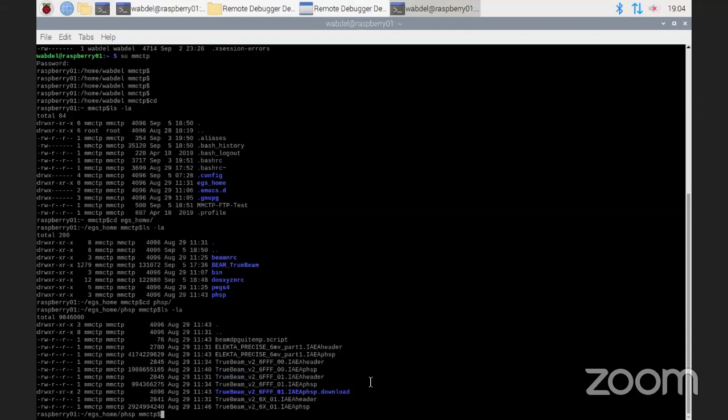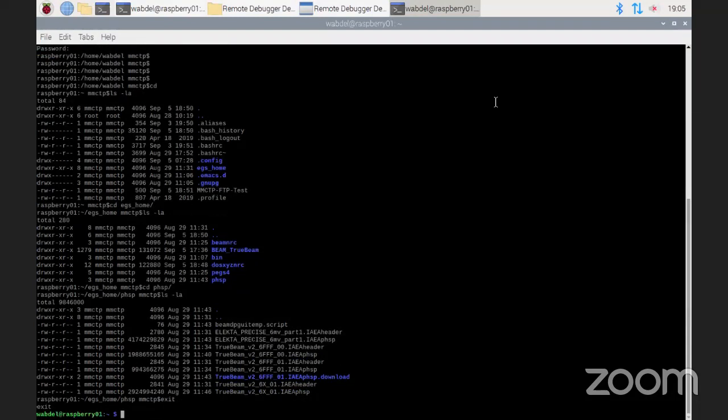And then they give the geometry for the jaws, the MLCs, and if you're using electrons, the applicators and so on. So I'm using the phase-space file as a source for the BEAM simulation, the BEAM model. So just to show you, let me switch back to my user, BEAM.